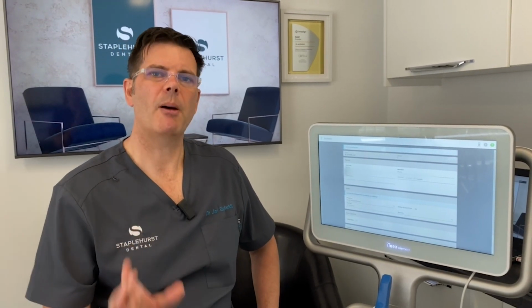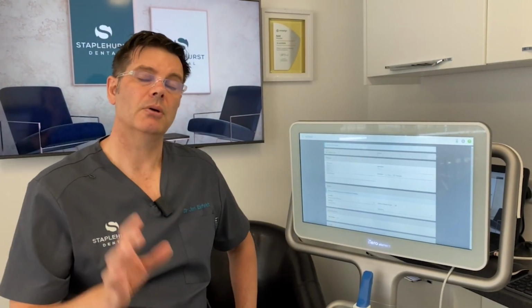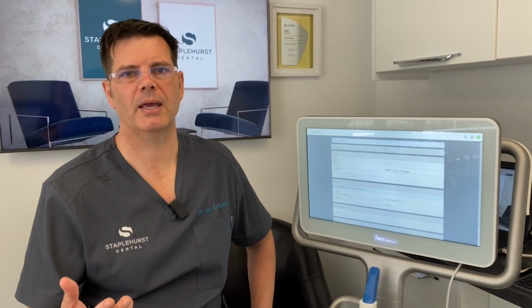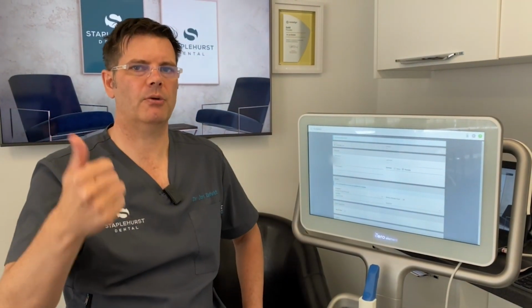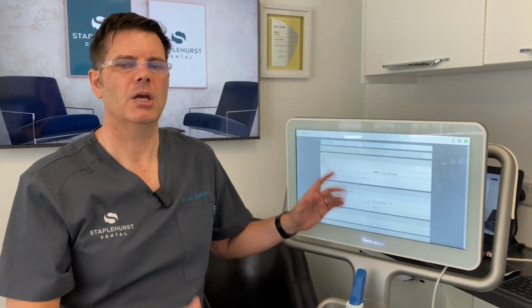The one thing you have to remember is that you can still only make the prescription from the iTero. You'll have to upload video and pictures on MyiTero.com, so that could be on your PC, on your Mac. And then you have to send the case from the iTero. So you just have to remember this workflow: iTero, PC, iTero, because once you've sent the case from the iTero, you can't add extra pictures onto it again until you send another scan.